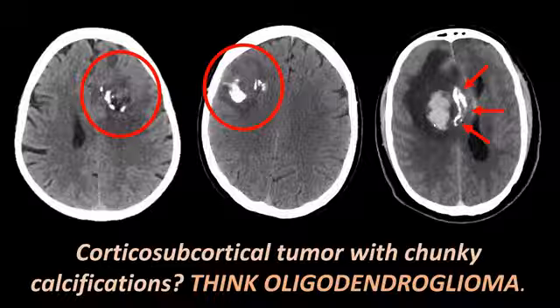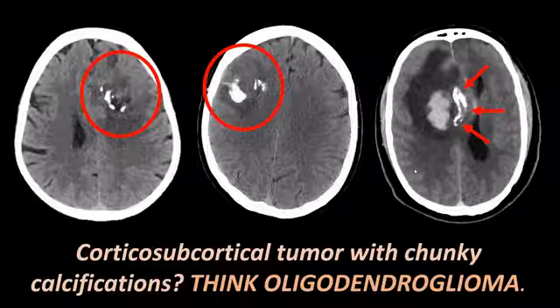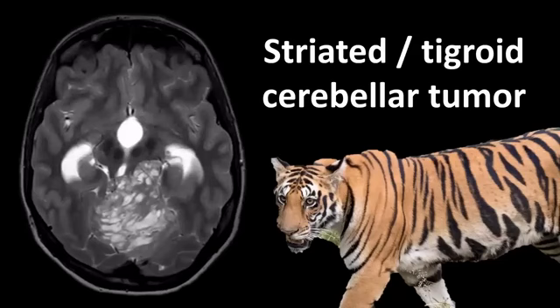Now, if you see this, it would be difficult to see the underlying tumor in a normal situation on an unenhanced CT of the brain, but we see the coarse calcifications medially of the hemorrhage, which immediately made us suggest that this is a tumoral hemorrhage in a patient with oligodendroglioma, and also in this case, our guess was correct. This is a classic Aunt Minnie of a very rare tumor.